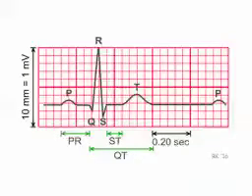The ECG has certain standards. The strip moves at a certain speed, which is 5 large squares per second, and therefore each large square represents a time of 0.2 seconds, meaning that each small square represents a fifth of that time, which is 0.04 seconds.